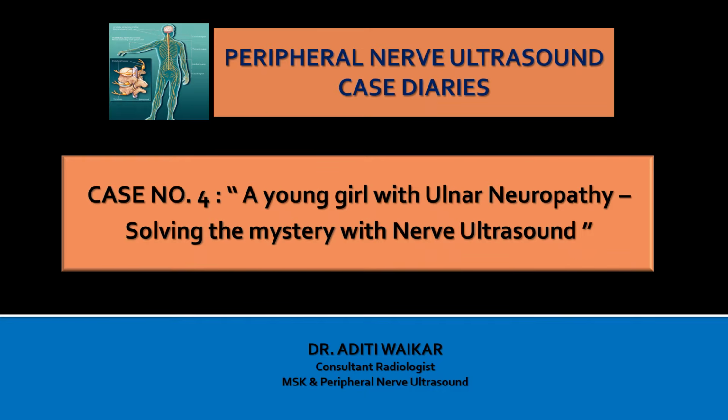In today's video, we are going to discuss a rather rare cause of ulnar neuropathy in a young girl and how nerve ultrasound helped in arriving at the accurate diagnosis.